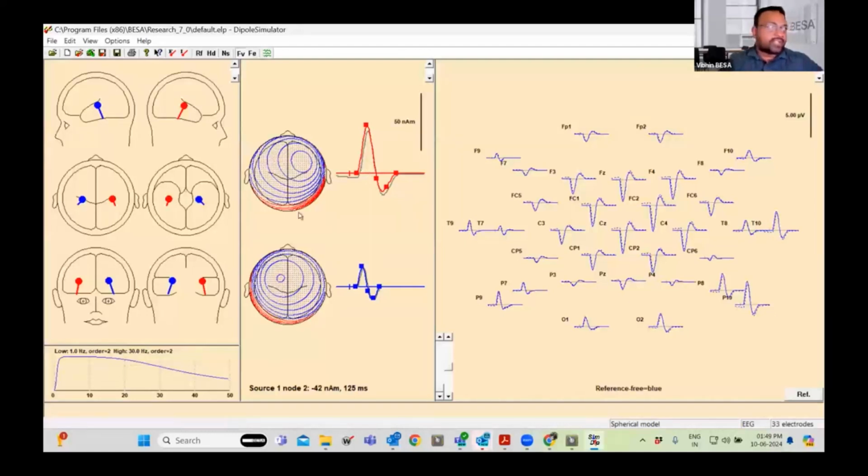So I think I have explained. The takeaway message which I wanted to share here is, when you're applying filters, you need to ensure that the closer your filters are to the frequency of interest, the greater the effect of the filter on your signal. So give some breathing space to the filters, and you need not be very aggressive with the cutoff. You should give some space for the filters to have.